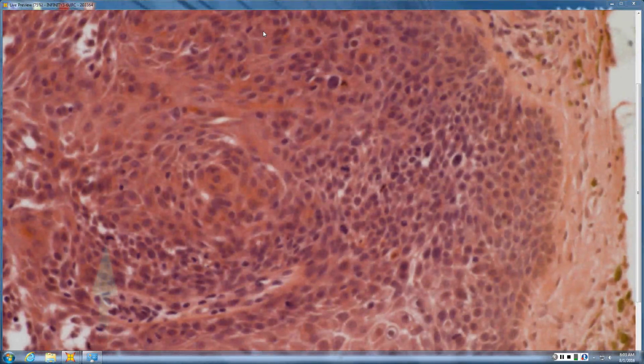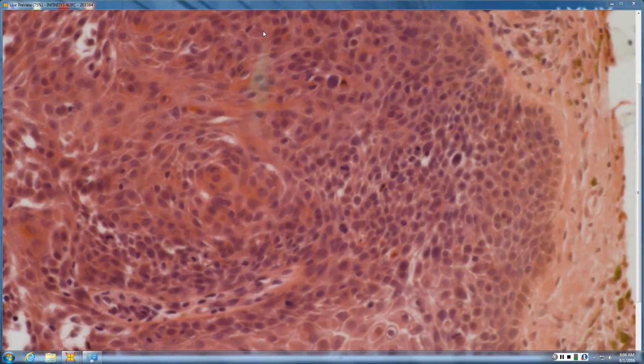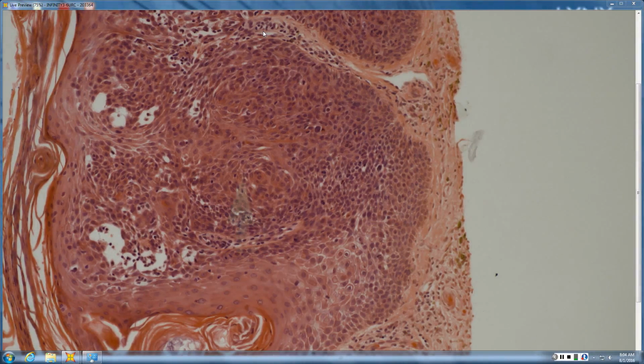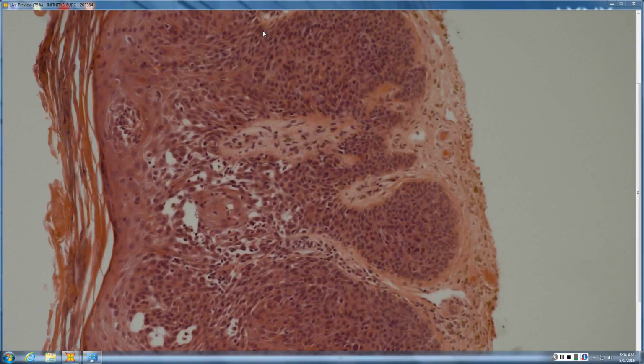You have lots of mitoses. You have cells that are large. Do you see any irregularity of the nuclear envelope? Maybe a little bit. To me, they're mainly round to oval. There's a lot of spindling, and what are these whorled things? If you saw them in a tide pool, you'd call them eddies. Yes, squamous eddies. So lots of squamous eddies and spindling. So it's an intraepithelial clonal proliferation with lots of squamous eddies and spindling.